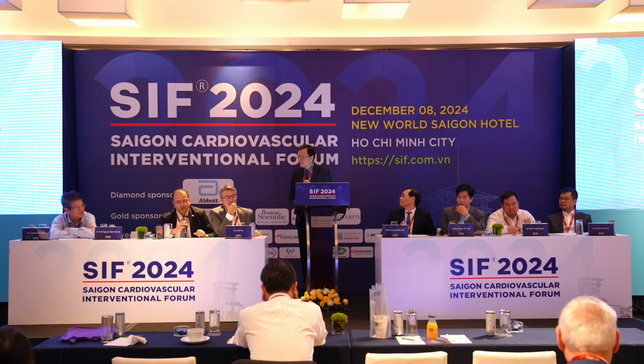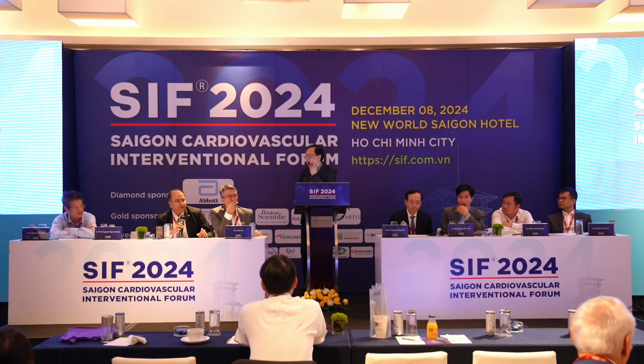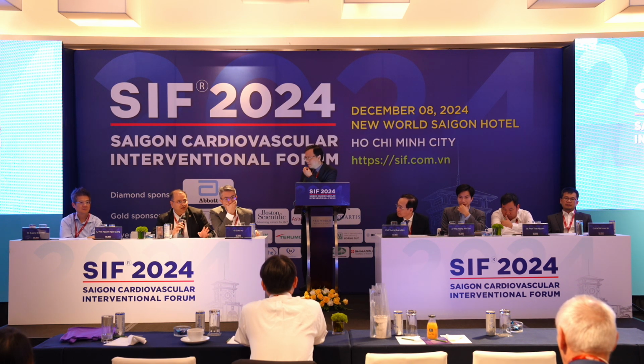Hi, Dr. Wu. I'm very happy seeing your initial slides. Your protocol of doing rotablation in your center is exactly what I do in my center. What's interesting in one of the slides is that most of the burrs which get stuck are the 1.25 burr. The 1.25 millimeter burr is the one which gets stuck the most. 1.5 is much less. People always think taking a smaller burr will help. No, because of the shape of the burr, 1.25 is the one that gets stuck.